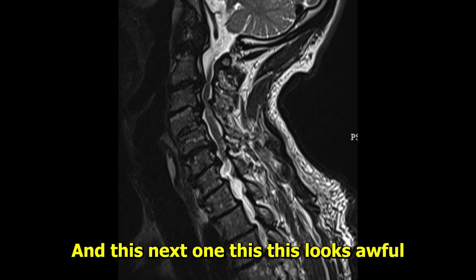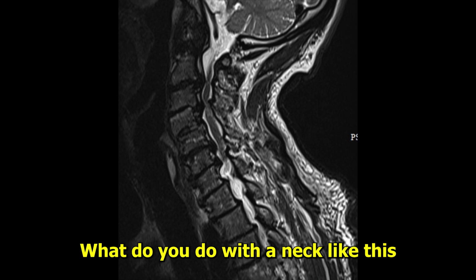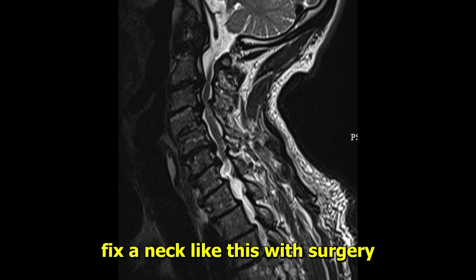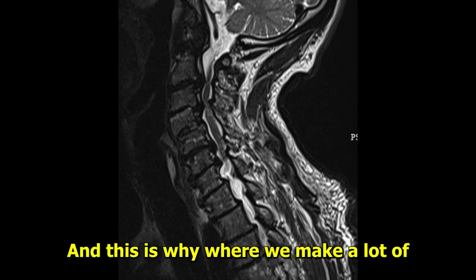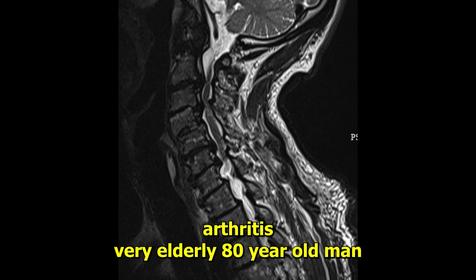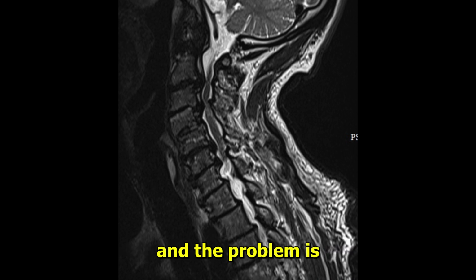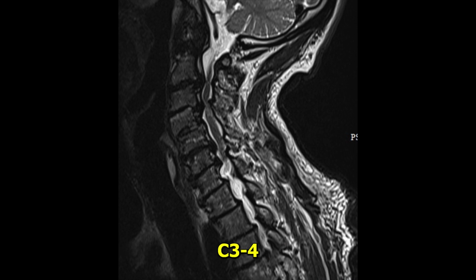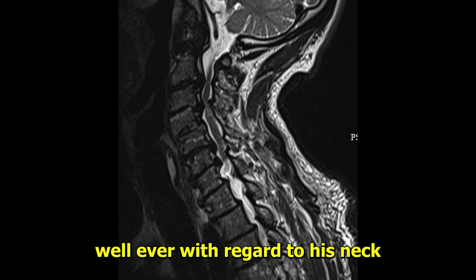And this next one, this looks awful. What do you do with a neck like this? Just terrible cervical spondylitic myeloradiculopathy. You can't fix a neck like this with surgery. And this is where we make a lot of mistakes. We try to operate on people that have terrible arthritis. It's a very elderly 80-year-old man, but the problem is his spinal cord's at risk. So they're going to have to decompress C3-4, but he's not going to be well ever with regard to his neck.